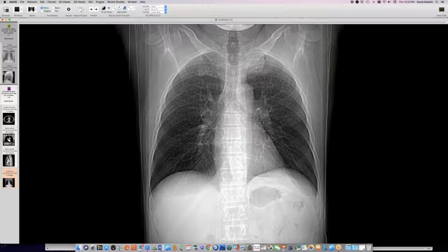Is it sort of from a ligamentous soft tissue injury as opposed to the fracture, and it just fills in? I think what happens is that the root sleeve gets torn a little bit, and fluid collects then in the extrapleural tissues and forms a pseudomeningocele up here. So it's not completely lined by meninges, because that nerve sheath capsule tore, and the fluid leaked out.